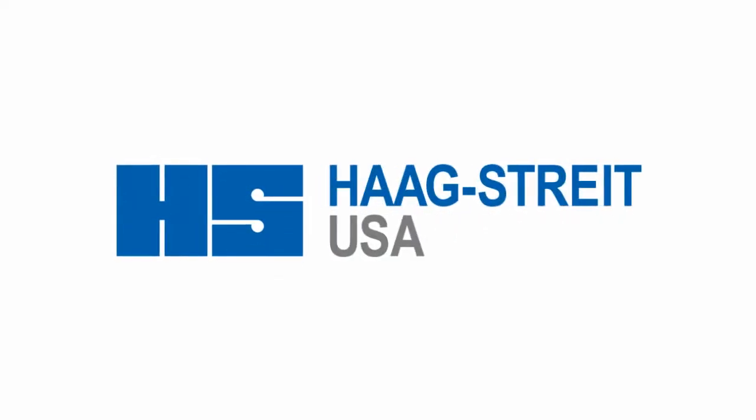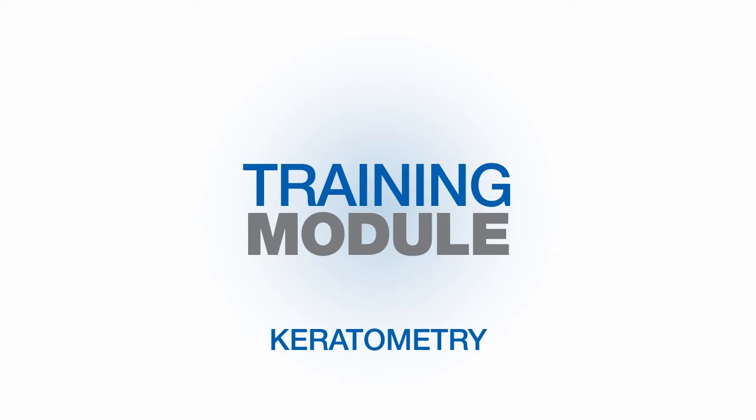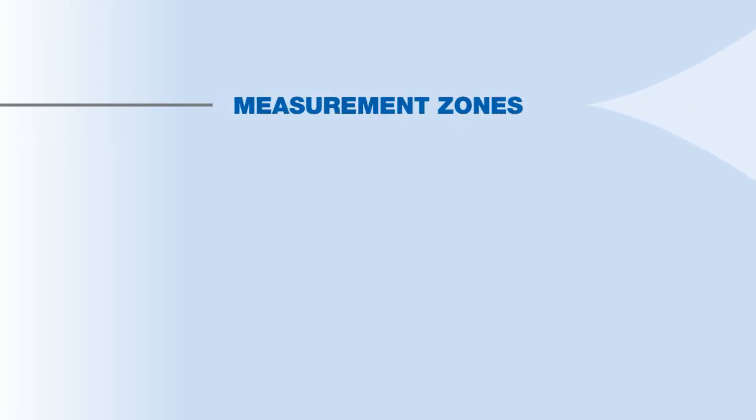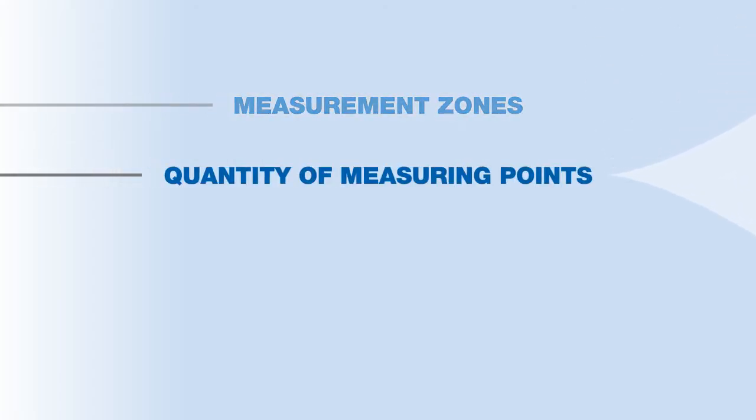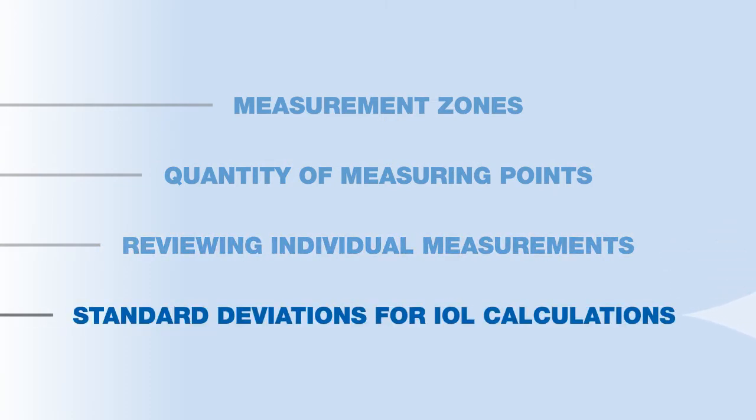Welcome to Lenstar with iSuite training module on keratometry. This segment will illustrate the keratometry features of the iSuite software. In this training module, we will discuss the measurement zones, quantity of keratometry measuring points, reviewing the individual keratometry measurements, and the acceptable standard deviations for use in both standard and toric IOL calculations.